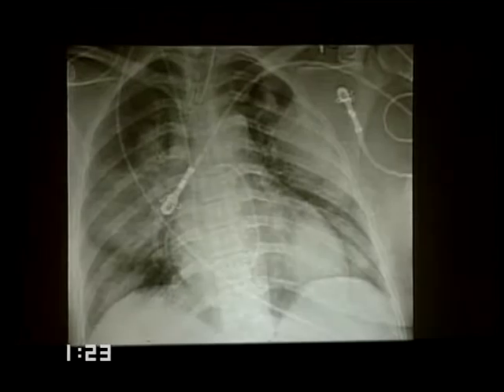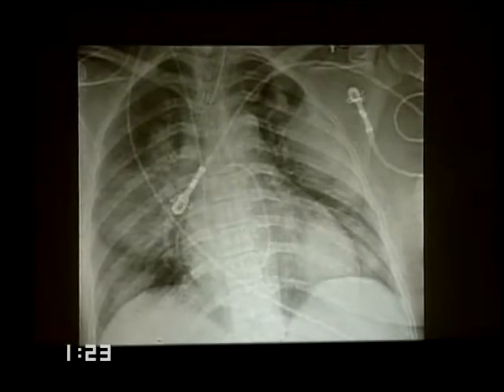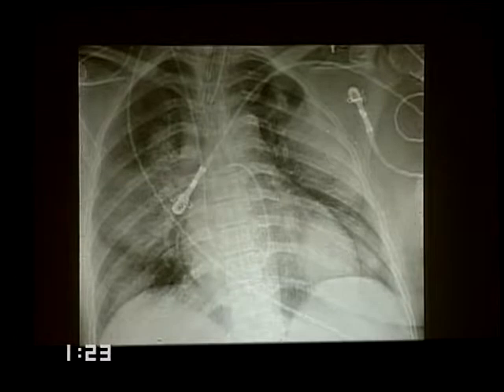An example of a community-acquired pneumonia, multilobar. When you see a multilobar inhomogeneous process like this, it could be blood, it could be bronchoalveolar carcinoma, or it could be pneumonia. Which occurs more commonly? Pneumonia occurs more commonly.